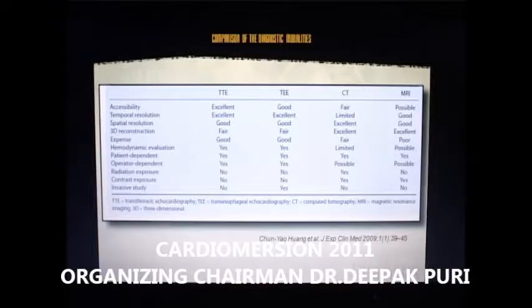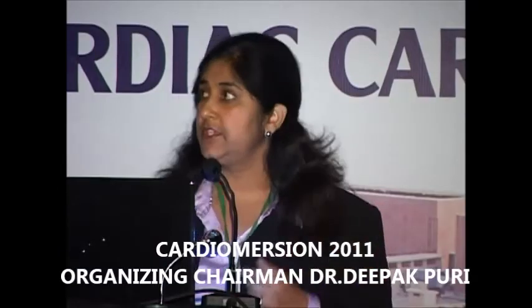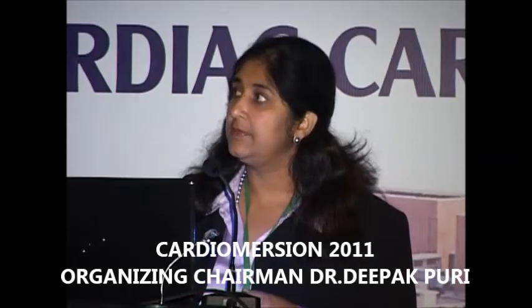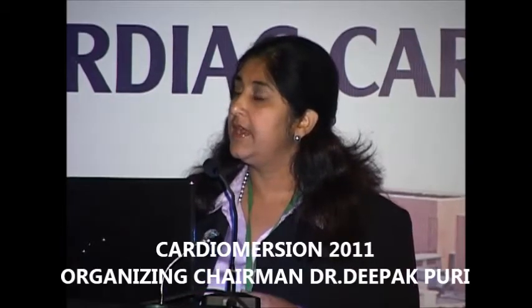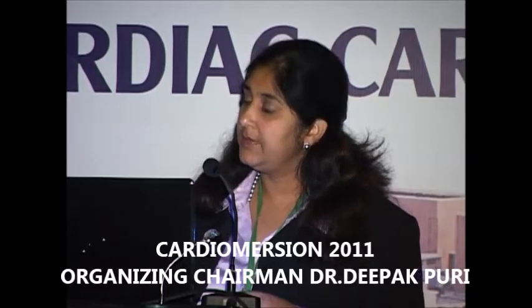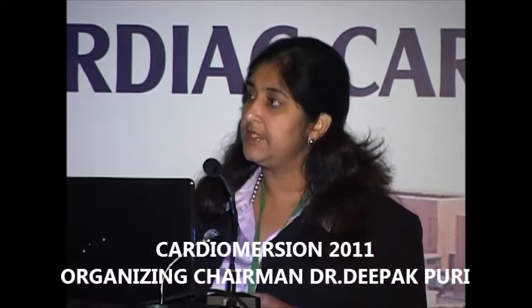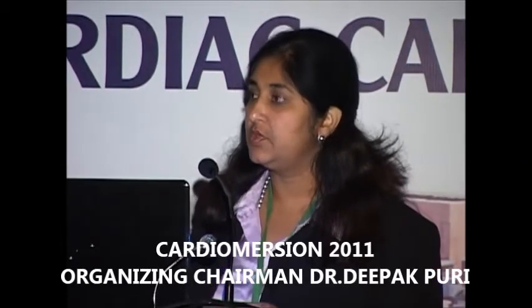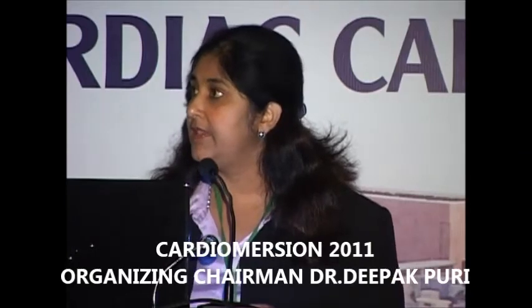So I emphasize that even if you have a non-contrast CT, do not just blow it off. Just take a good look at it. Sometimes you may find something there. And then there is hemothorax, blood in the pleural space. And this was the TEE performed on this patient, which demonstrates the true lumen with the blood, and this is the thrombosed false lumen. And that, of course, is the effusion that we saw on the CT very well.